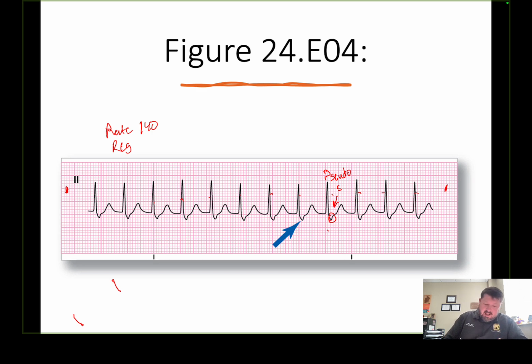I've got a P wave that is inverted post QRS. I don't have a PRI, and then I've got a QRS that's about 0.04 seconds.